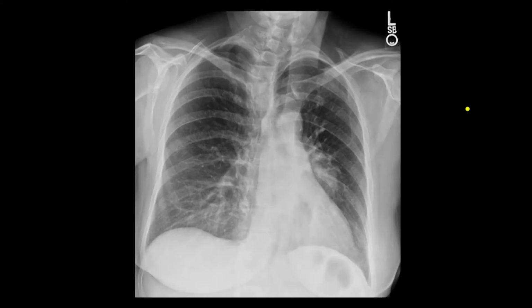This patient, again, we're going to be looking closely at the left hilar region, and the patient had a cough, and we're following down from the aortic contour, and so we can see the aortopulmonary window here, but you can see that there's this irregular mass which really doesn't look like the pulmonary artery coming down here. And so in this patient, the lateral view was very helpful.